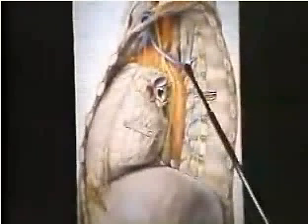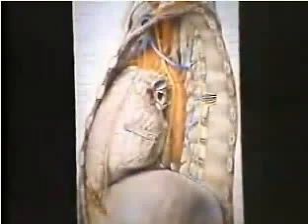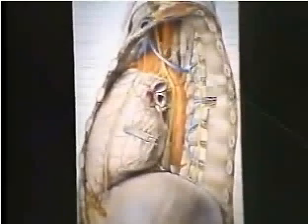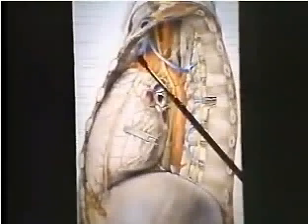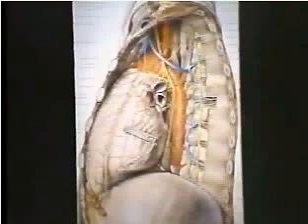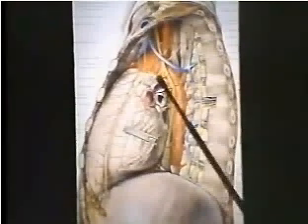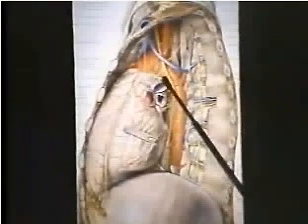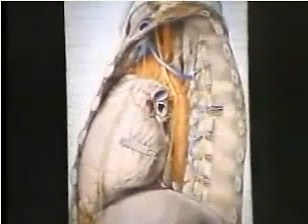Now, what vessel should be running in that region? Well, let's look at the anatomy diagram again. If we look at the left side of the mediastinum, there is a vein which drapes across the aortic arch. Now, the artist has drawn it here right at the top of the aortic arch. In fact, it may cross way up here and be very inconspicuous. It may cross along the convexity of the aortic arch, as I'll show you in a moment, or, as in the present case, it apparently droops down far enough to reach the AP window and helps to fill in what should be a concave region here.